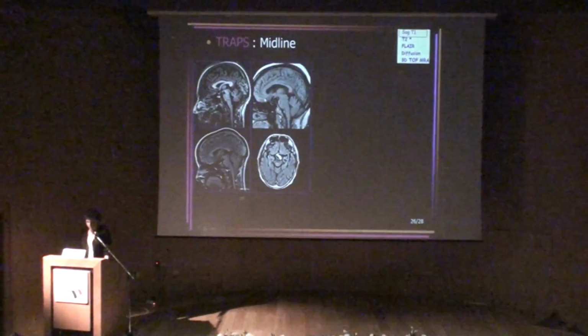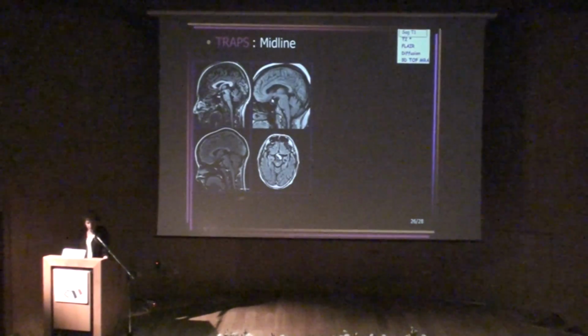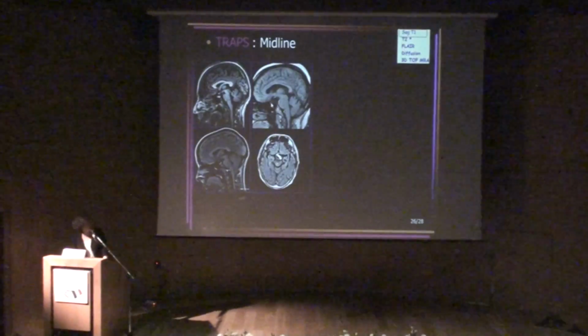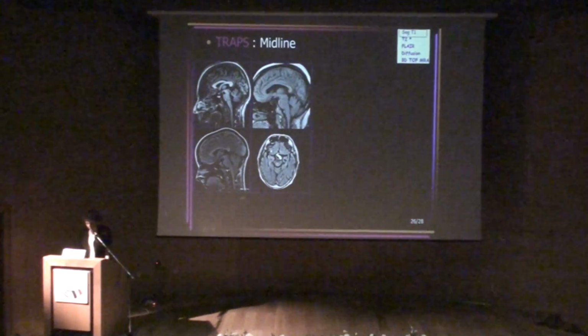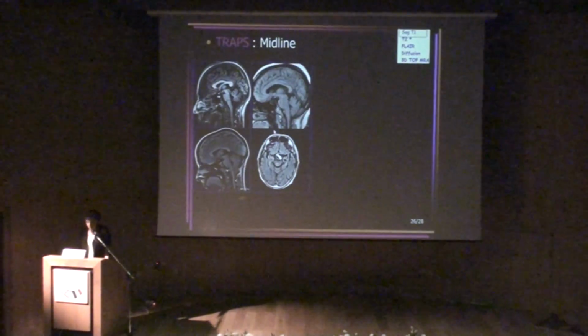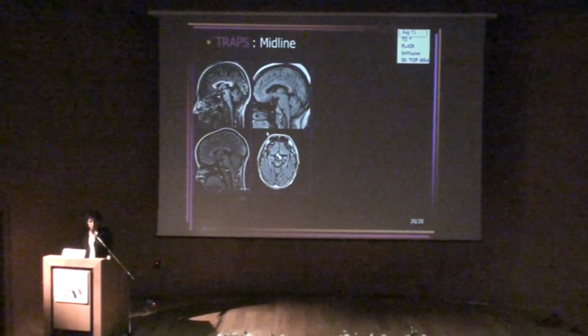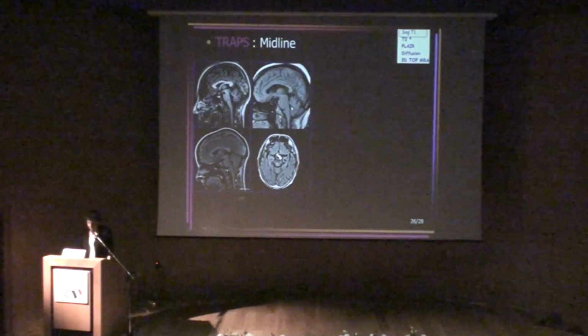The second thing that you shouldn't miss is if you have a heterogeneous signal on the pituitary region. Maybe it's not obvious on the slide here, but look at the FLAIR sequence. You have a round-shaped lesion here. It's not far from the Willis circle, so you must think about one thing: an aneurysm.